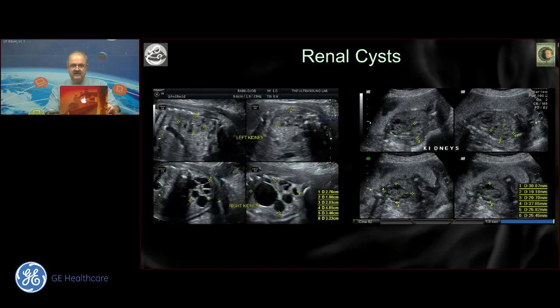That there are large cystic spaces outside on the periphery, and that is what looks abnormal. If you do a casual glance, you will never pick this up. But if you're aware of the condition, you will always pick this up, and that becomes useful because it has a tremendous bearing on the outcome.